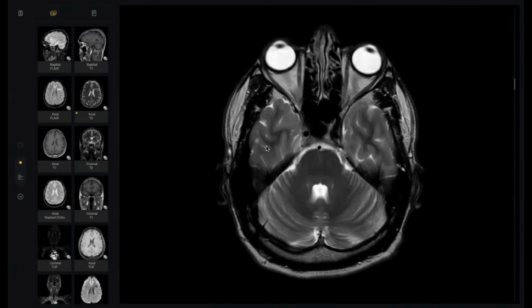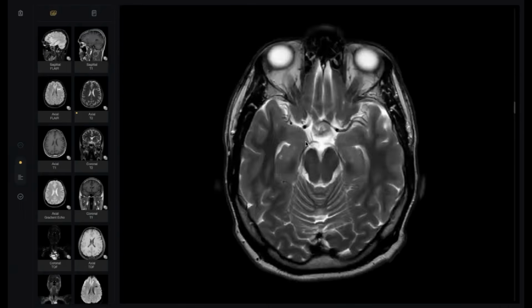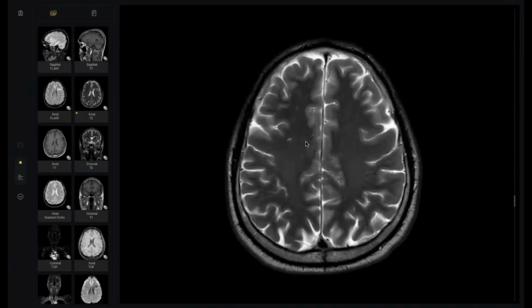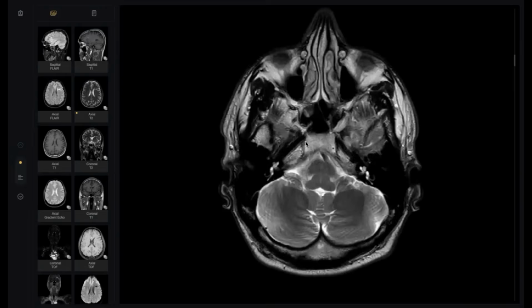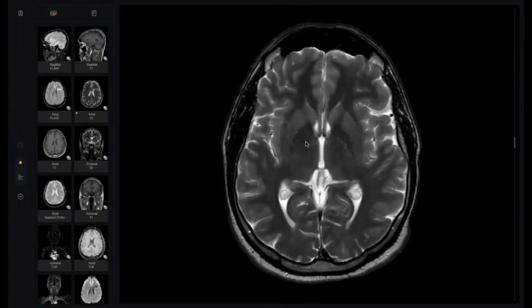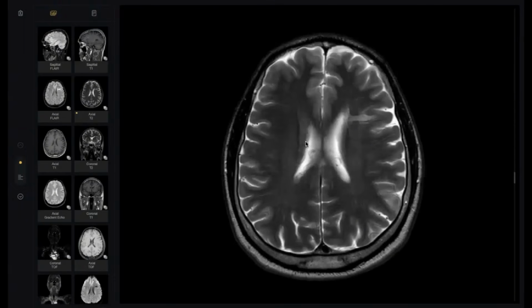Sir, there's a problem with the remote. I cannot scroll properly, sir. Can you scroll for me, sir? Okay. You can stop me at the slice of interest. So I can appreciate a linear T2 STIR hyperintensity extending from the left lateral ventricle and periventricular region.